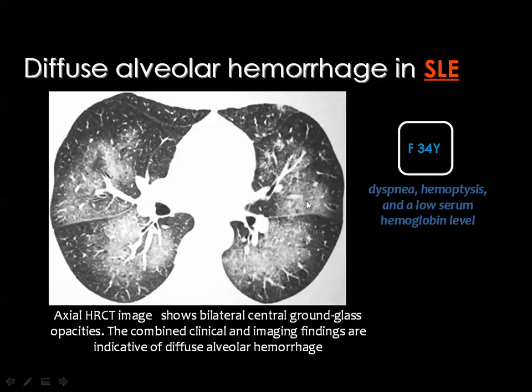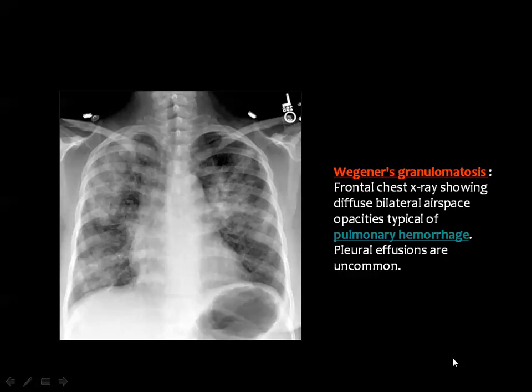She showed the chest X-ray, and the high resolution CT showed multiple pulmonary parenchymal opacities with little air bronchogram. The opacities spare the periphery of the lung, and in the clinical setting, the diagnosis is suggestive of pulmonary hemorrhage.